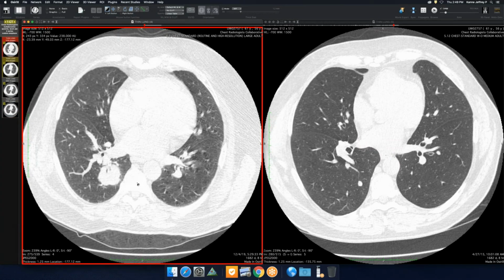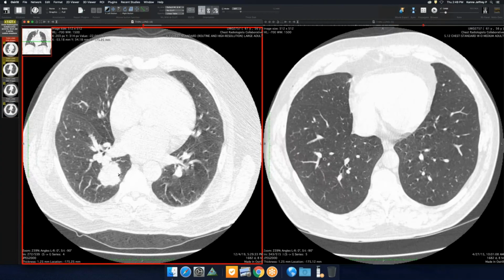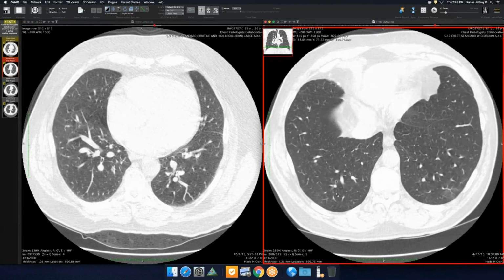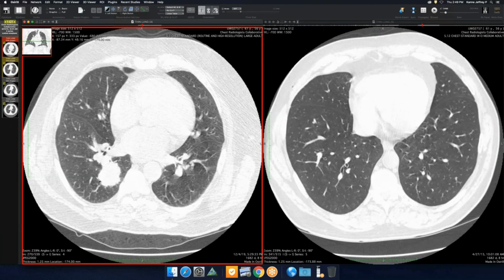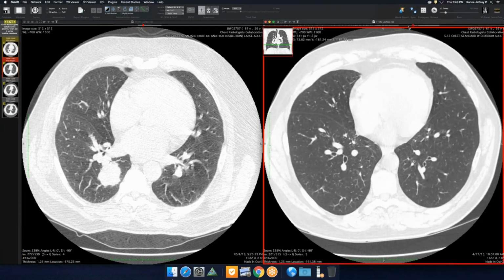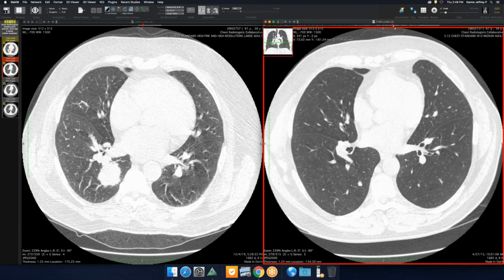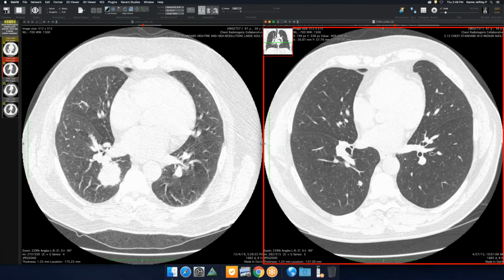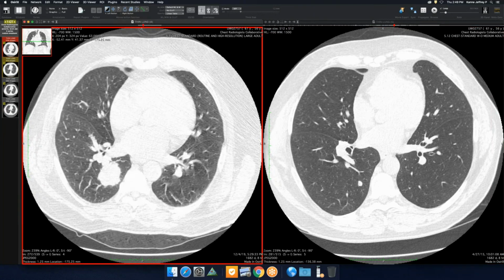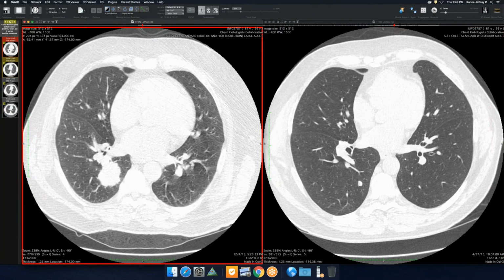Now, the patient presents with a big stroke, and the chest CT was done because this mass was picked up on a radiograph. We got the outside images transferred to us, and there's this new mass here, right in the expected location of the old one. It can come up right there. So the presumption is this nodule is now this mass, and it's presumably a primary lung cancer. They're not going to do anything to pursue it at this point. The patient had a pretty bad MCA stroke and does not wish to pursue any workup.